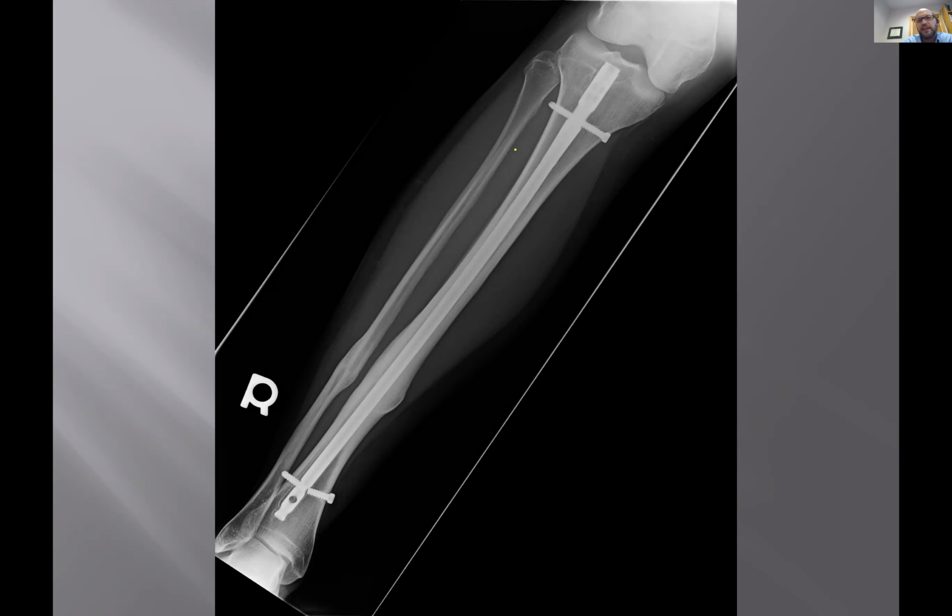Yeah, not so much here, not so much here, more in here. And you can see it's kind of bulbous, and it's beautiful. It's healed up really nice. The fracture has healed. There's good cortical union. There's still some remodeling. There's a kind of both-bone fracture, you know, a ski boot fracture.